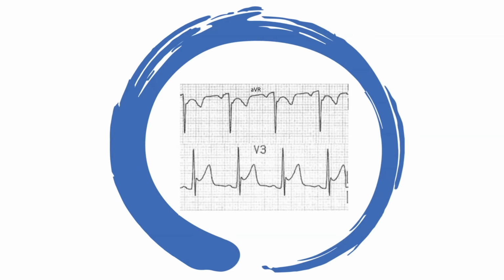Hello everyone. What abnormality do you see on the strips on the screen? Go ahead and pause the video and think about an answer.